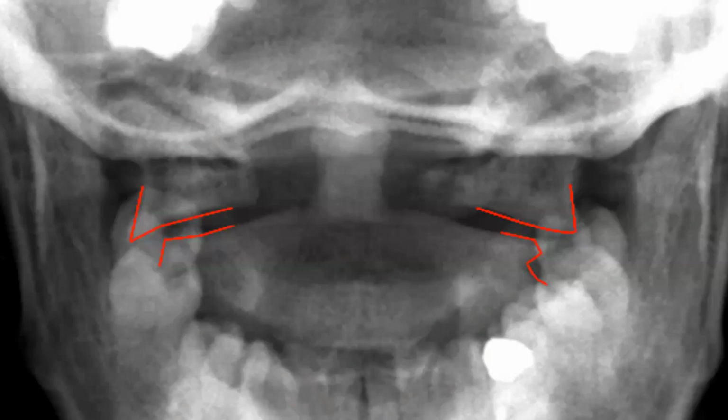What is the problem here? Sir, there is misalignment, so C1, C2 fractures. What is the problem, C1 or C2? C1, sir. Which one is going out? The ring, the C1, right? Yes, sir. If you find the C2 going out, it means the fracture is in C2. Clear? Yes, sir. So C1 is going out, it means the fracture is here. It's obvious here. Okay.